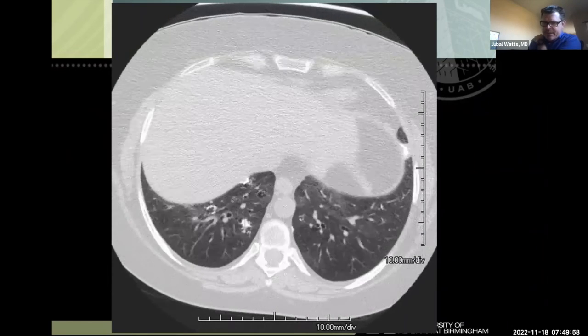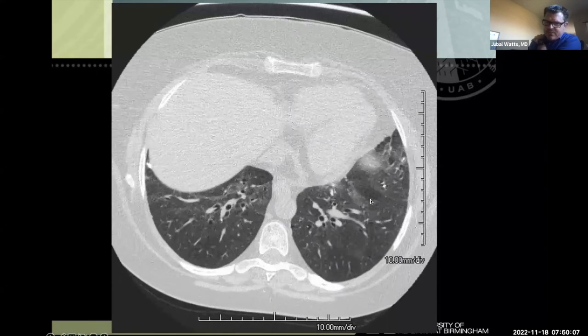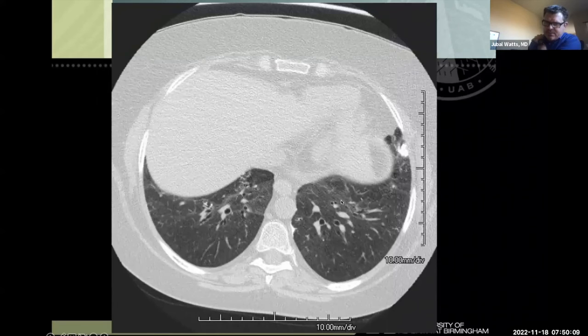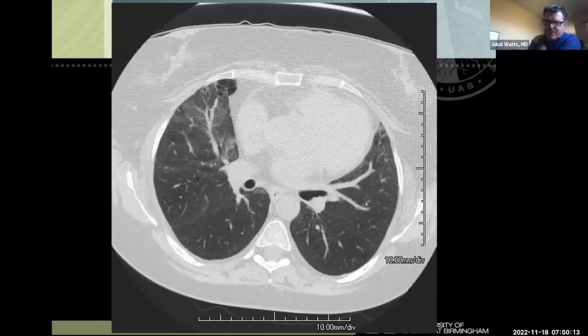So we're coming down on the bases, and we do have abnormal ground glass. You can see there's all this ground glass density here. Here's probably some normal lung. A lot of abnormal ground glass kind of along the axial interstitium, or kind of peribronchovascular in distribution in areas.